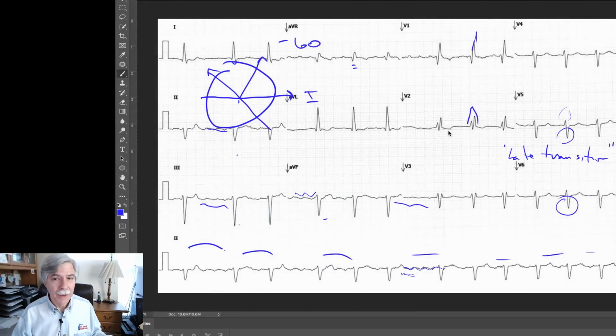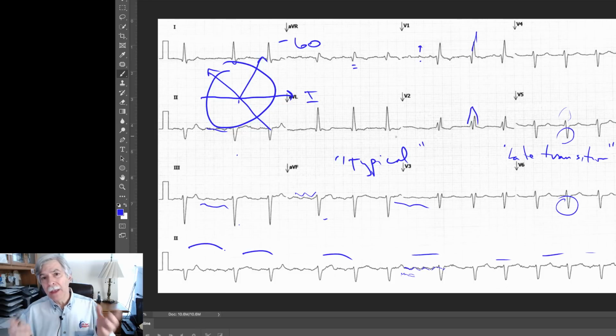If you look here, I'm going to show you the EKG again. In the inferior leads, the sawtooth pattern is down going, and in V1 here, it's going up. When the inferior leads and V1 are going in opposite directions, that usually indicates typical or common atrial flutter that's going in the counterclockwise direction. I'm going to explain what that is, because it's important that you recognize it, and there's a good reason why. Because in atrial flutter, pretty much it's always the same.